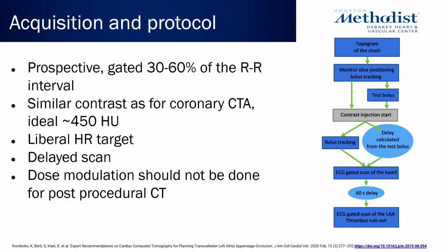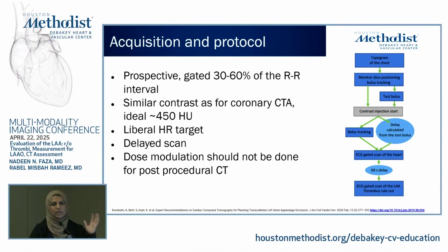This is a second acquisition, 30 to 180 seconds after the initial scan. We would time it at the peak of the contrast injection for the initial scan. The guidelines recommend ideally this should be 60 seconds after the initial, but anywhere from 30 to 180 seconds after is acceptable. Important to know, some centers will do retrospective imaging in the initial scan. Others are doing prospective. We do flash systolic imaging.